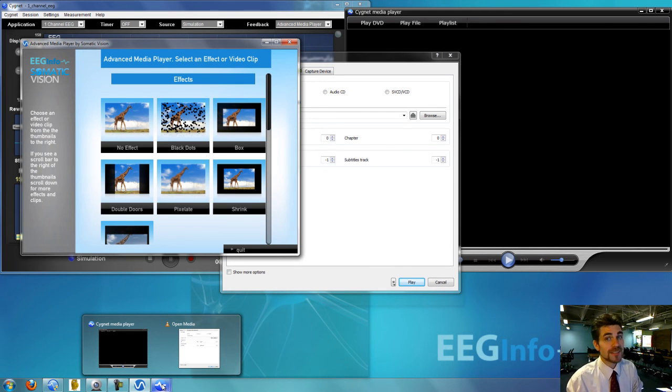That is Advanced Media Player. I hope you enjoy it. It's available only in Cygnet, and it is a great way to play video files and movies and DVDs for your client as part of the feedback process, adding a great deal of variety to your neurofeedback sessions.